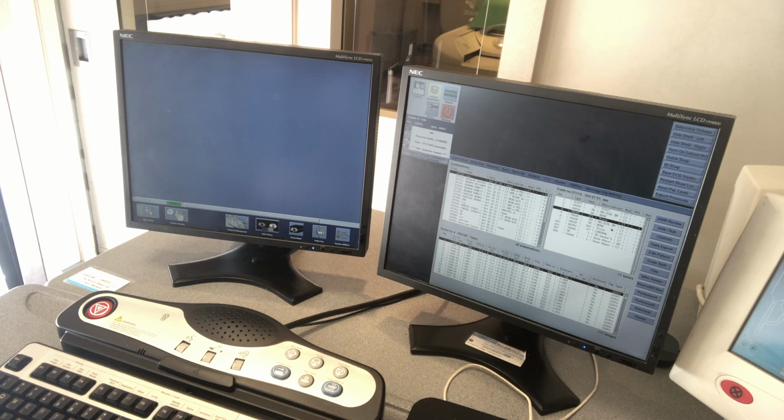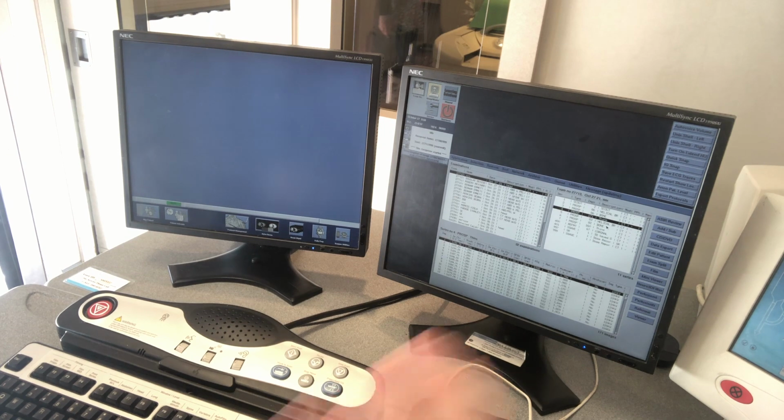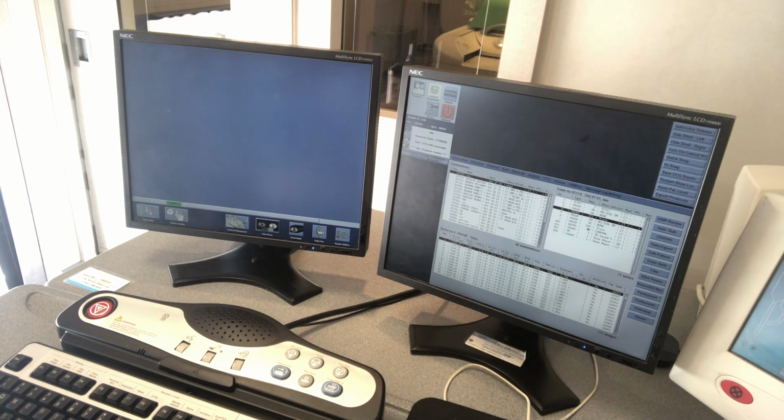Alright, so now, why do I have two thins? Because we repeated. So when we repeated, it's going to give you two sets of thins. You never want to send thins to PACS, but if you do, there is a way to delete it. So now we've got to highlight everything that you want to send to PACS.